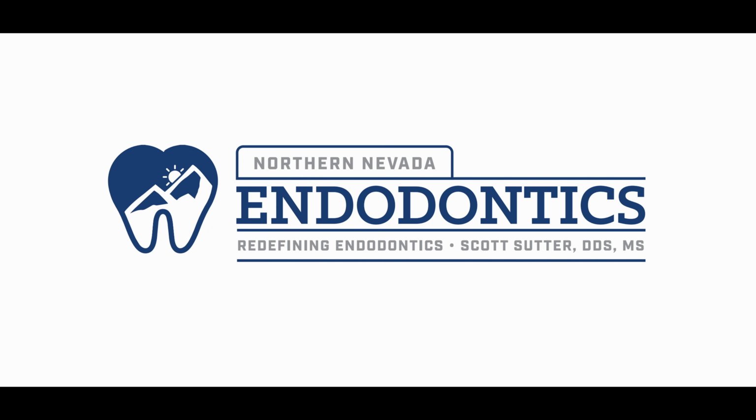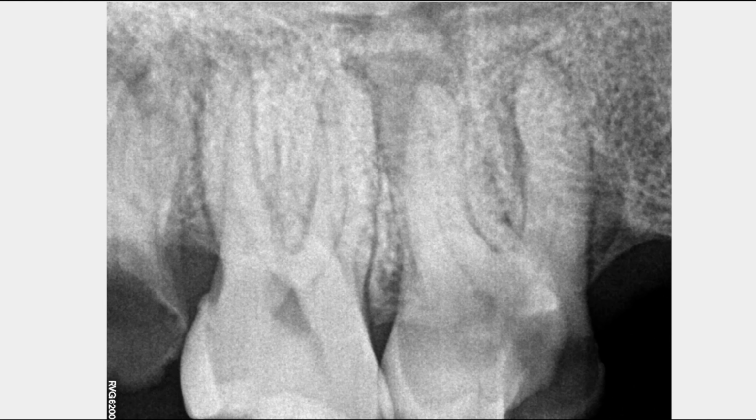Hello, everyone. I have a quick case today that I thought would be interesting to look through, and I want to talk about why I think imaging is so important for the treatment planning of a case. So, this is the case that was sent over to me.